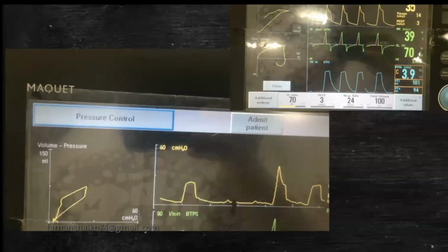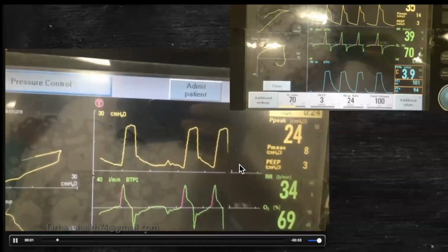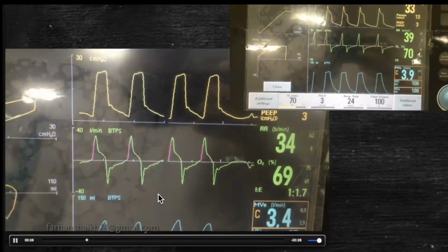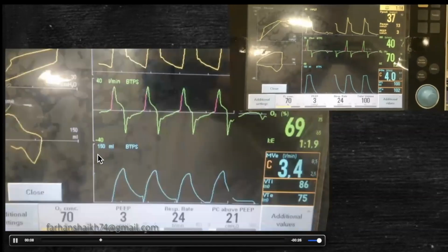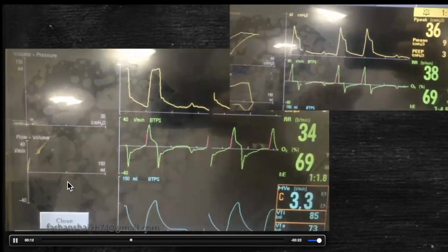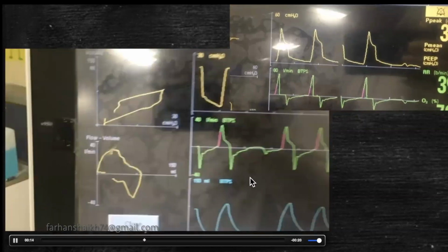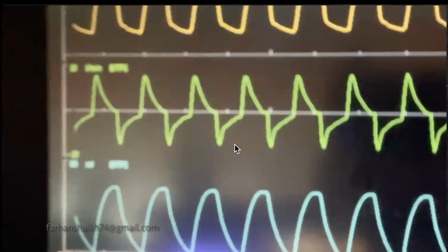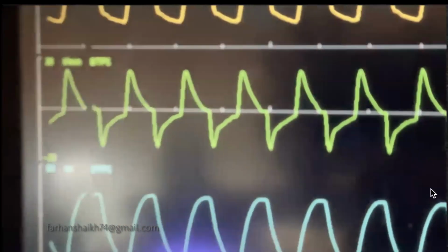And after good bronchodilator therapy, the things have changed. And actually, the patient is shifted to pressure control mode also. So you can see the decelerating flow. But you can see after bronchodilator therapy, the flow has definitely improved during expiration in the flow volume loop as well as during the flow time scalar. So you can use the pulmonary graphics to assess the response to your treatment.